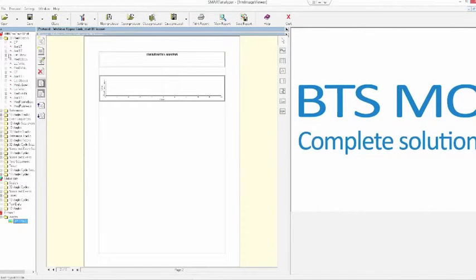Okay, so for example, let me add the lateral wrist, so I can choose a component, for example, the vertical component. As you can see, to add the graph, we have just to drag and drop the desired variable into the box. Okay, so that is the graph. So in this case, we have a plot of the vertical component of the lateral wrist marker in time. Okay, so what is instead a cyclogram?